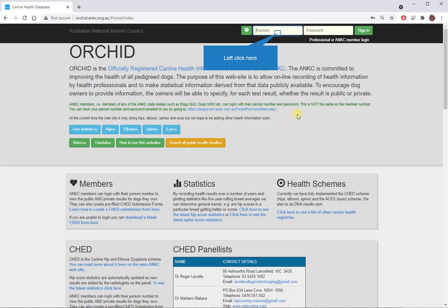This is a video for radiologists on how to use the ORCHID system for entering hips and elbow results. ORCHID is the officially registered canine health and information database for the ANKC, which is the Australian National Kennel Council. As a radiologist, you would be given an account.